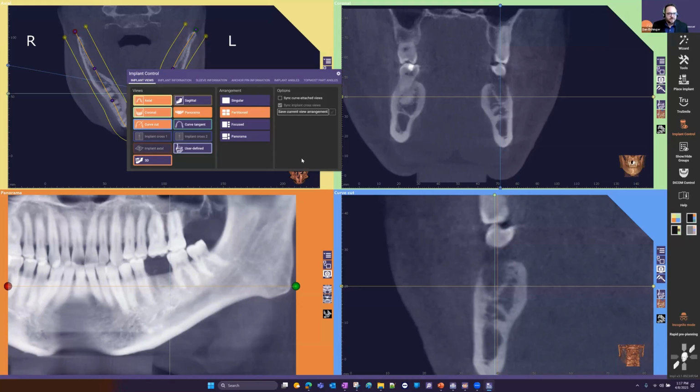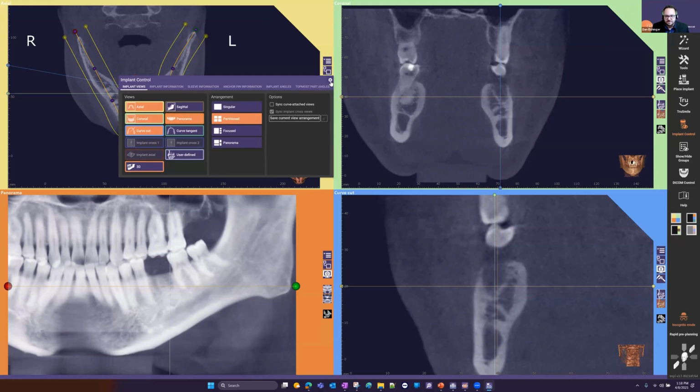So basically, you can fine tune the software and customize it to visualize the data how you like to see it. Whether you want to see a singular view, or specific views at specific steps, you have that ability to save that and really customize the software to the end user's liking.